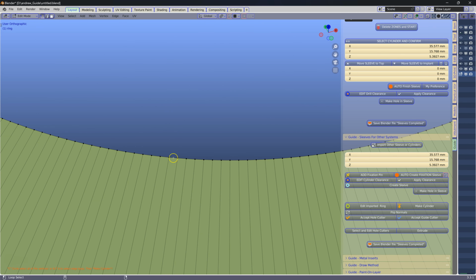Select the top of it, and then create your sleeve, scale it and then also in the Z direction. Make sure this time you don't intersect them. So S Z to make it a bit smaller. Then we're going to do the same with the next one. Find your hole cutters. You can find them over there with that button that I've just clicked, and do the exact same thing over again. Make sure you don't get them intersecting this time.